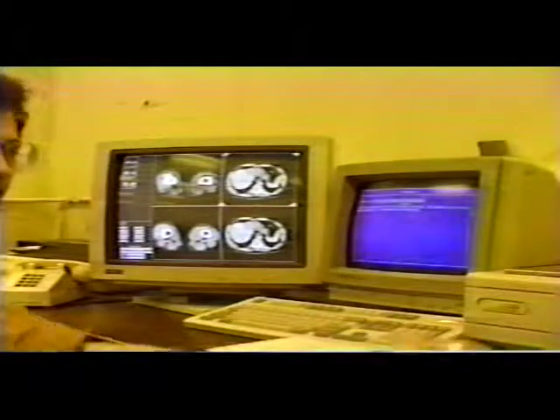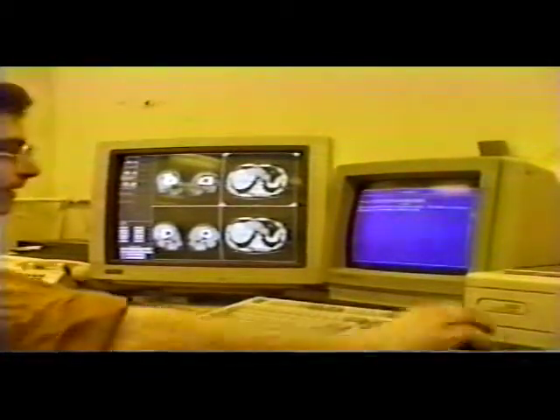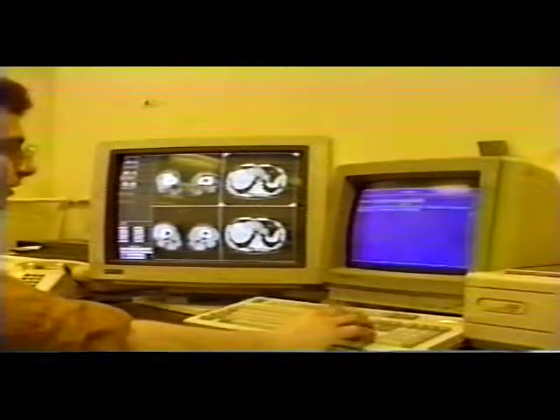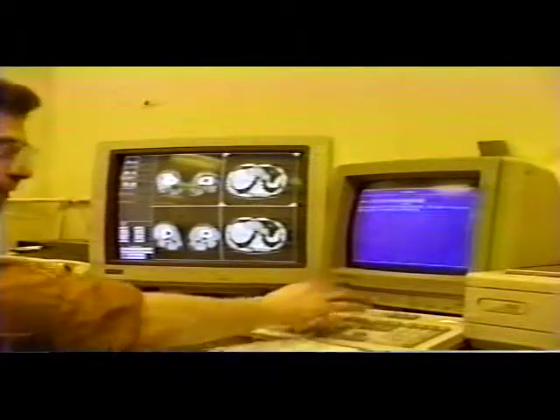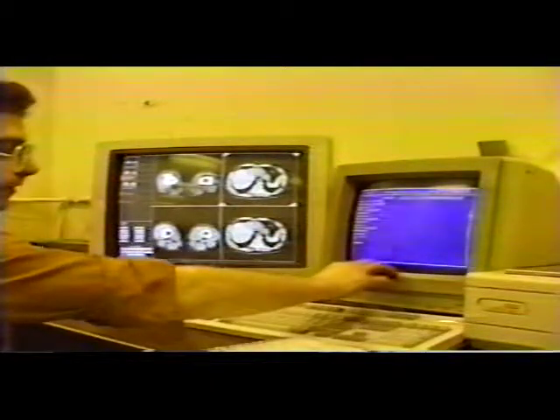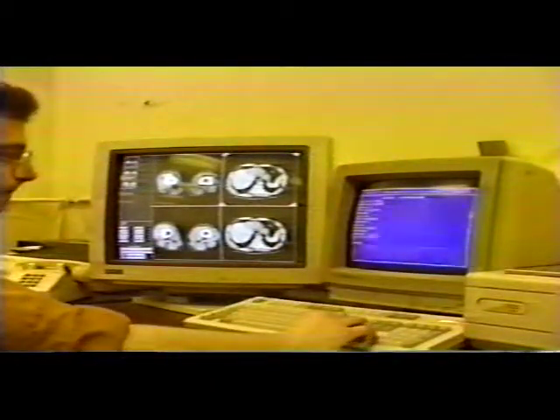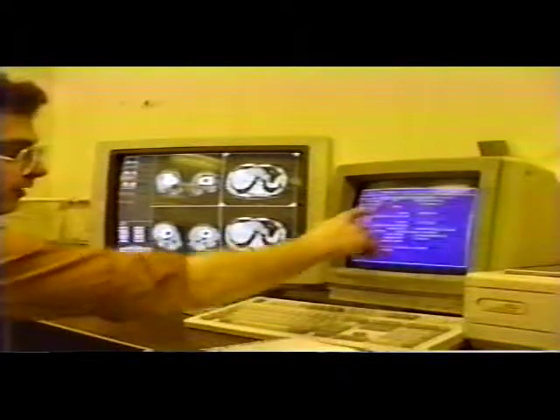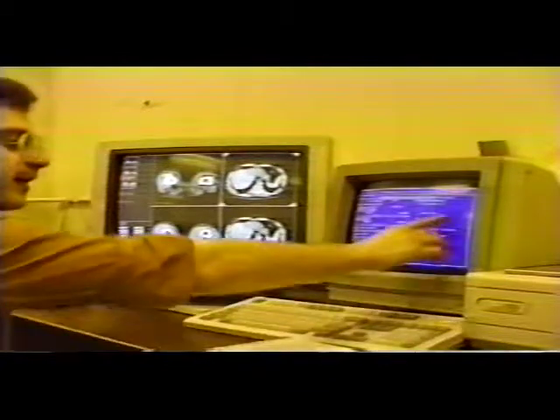On the right-hand screen is a report. There's a summary, and then there's the textual report that can go with a picture. With every image, there is also image information: the name of the referring physician, or comments. You can look at the experimental parameters, such as the kilovolts the X-ray tube was on, and the identification number.